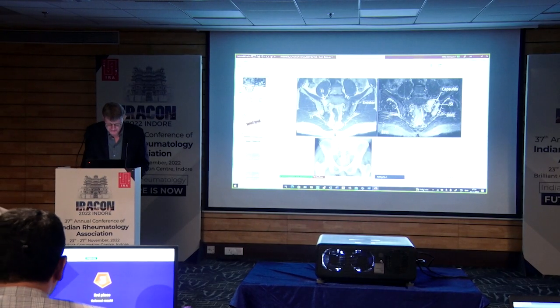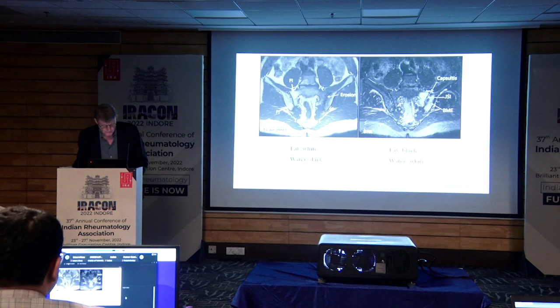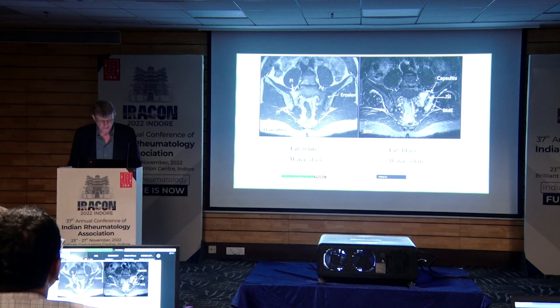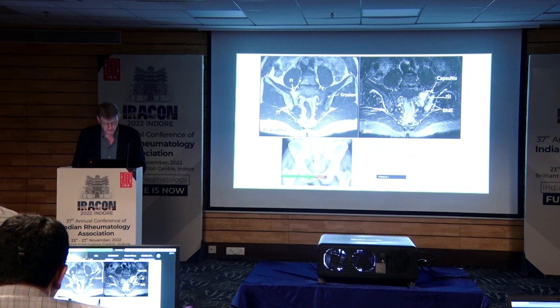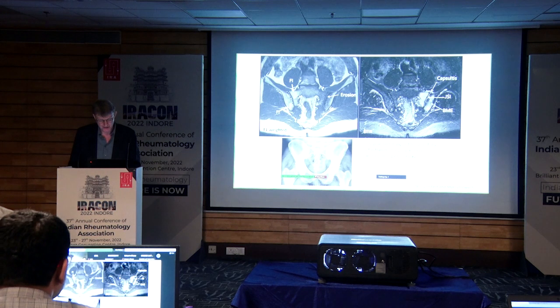Because for some reason I didn't have this slide in this deck, but this is just an example. You have seen the images. So this is the image you've seen already in the quiz, but these are the X-rays, and it's just to illustrate that you wouldn't be able to make any diagnosis based on this, because the joint space is quite nice. There is probably some sclerosis around the joint here. It's not terribly much, but the joint space is definitely open and nice. And that is just illustrating the time advantage you see by having MRI compared to X-rays.